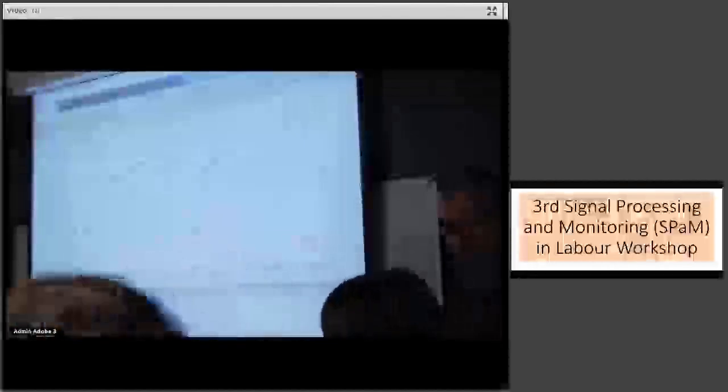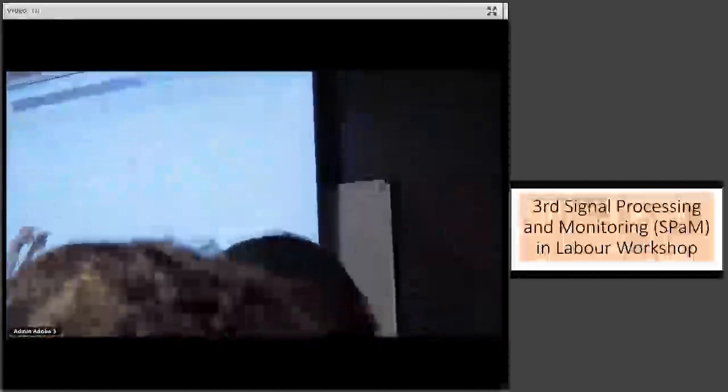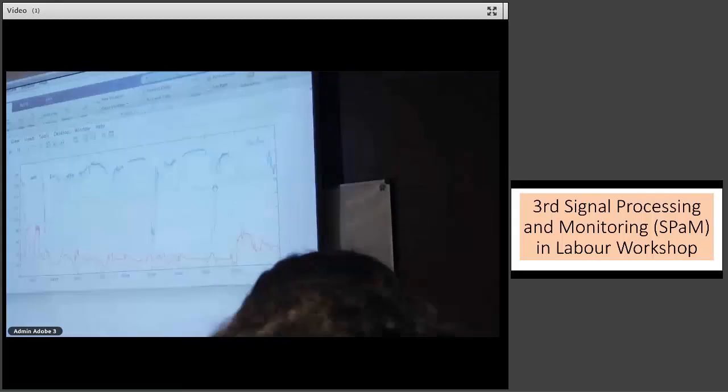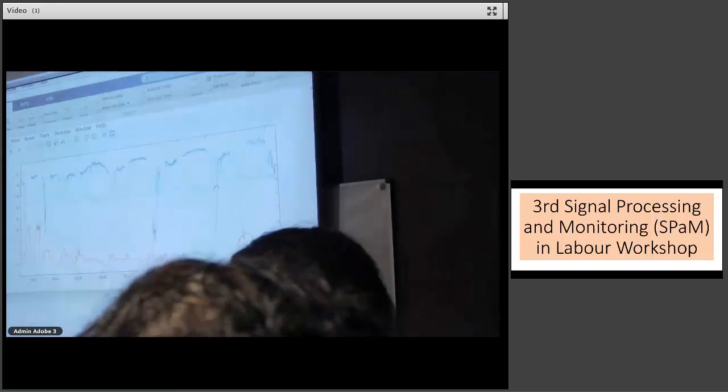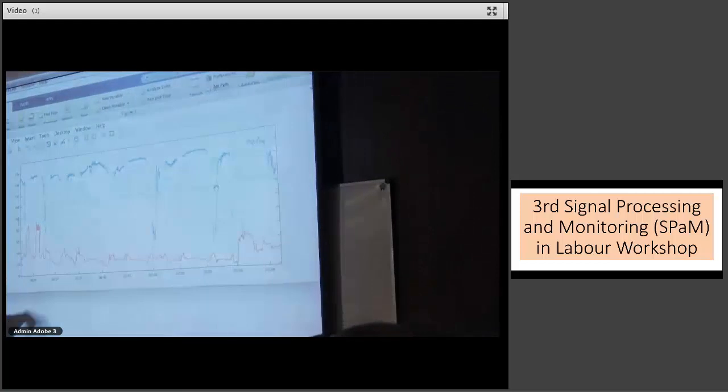So here, what I was saying is just before it changes the pattern, it has a very severe tachycardia and reduced variability. There's a period of many decelerations before, and that's why, from our point of view, we need to keep the baseline. Otherwise, we don't identify those repetitive decelerations before. I'm not going to touch it, but just before there were lots of decelerations, and then it changed the pattern to reduced variability, tachycardia. I don't know if you agree with that, Austin.